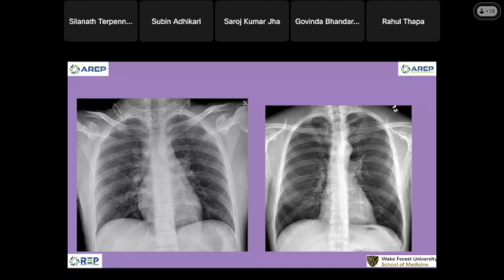Sometimes it's so big and it's covering the spine. So do we see any traumatic injury here? The chest radiograph study was done not so long apart, in the same person.